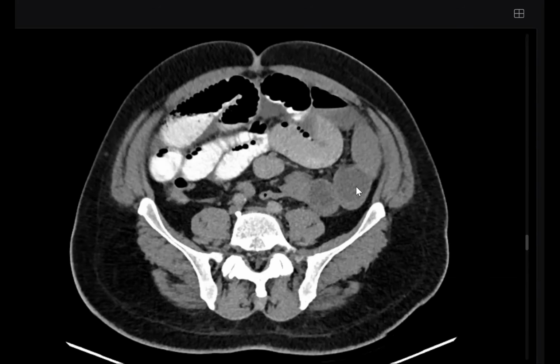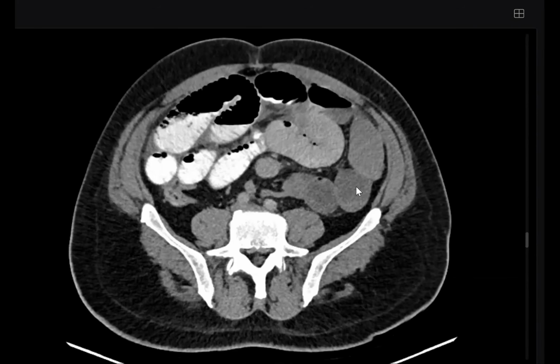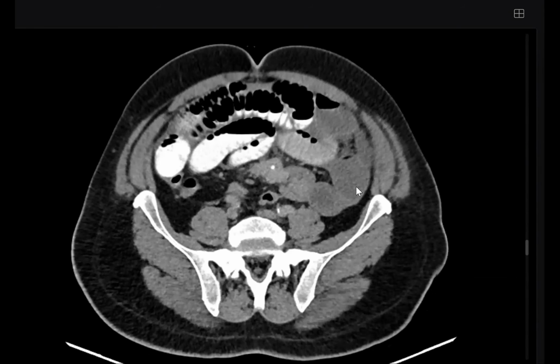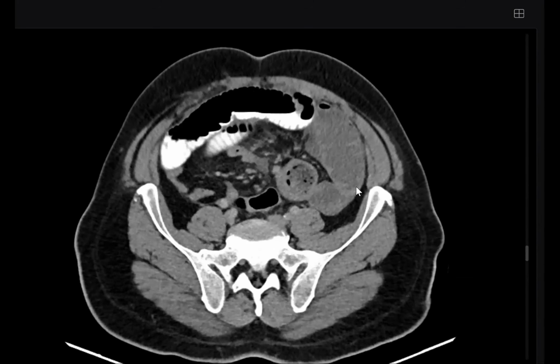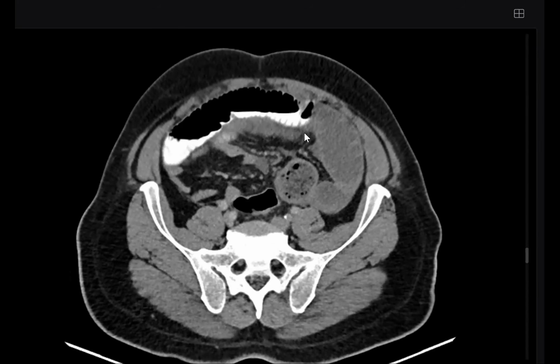So, sir, the finding. So it's a mesenteric mass. It's not bowel. Yes, sir. But it's adjacent to the bowel. Close to the transition point. Good. And I can appreciate, sir, there is significant amount of fat stranding, and there are small volume reactive appearing lymphadenopathy, which is also appreciated. Good. And over here, sir, at this point, it might represent some kind of retraction of the mesentery.